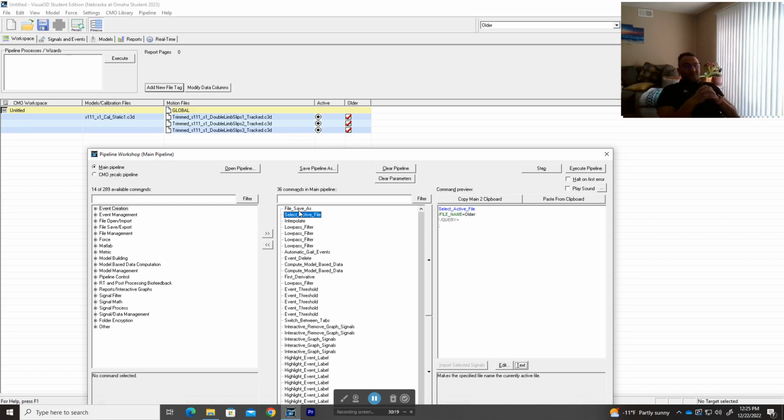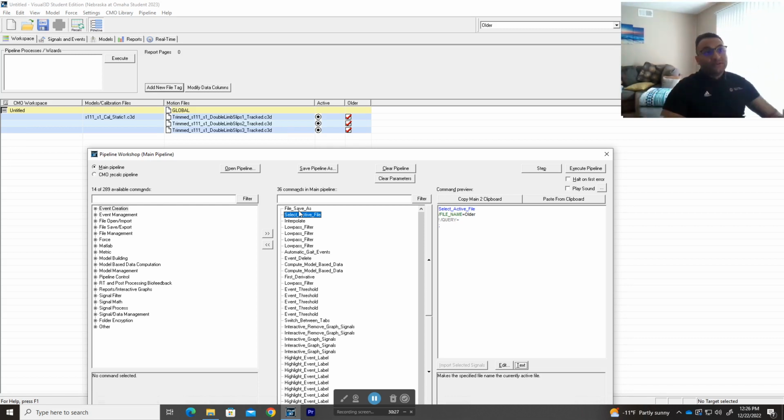So as you collect, you process, say, 10 older adults, and then you just collected another one, number 11, and you only want to add the rest since you've already processed all the ones before. You don't want to select the whole tag of the older adults, only the ones you did not process. So you can, for example, create another tag. What I like to do is create a tag for analyzed and a tag for not analyzed, and then I just add the not analyzed one to that tag.